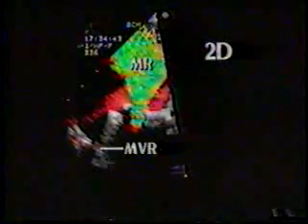In conclusion, accurate diagnosis of prosthetic heart valve dysfunction has traditionally been an exceptionally difficult clinical task. However, echocardiography has developed to the point where it can delineate most problems related to valvular prostheses. By using a systematic approach that integrates information from the 2D exam, spectral Doppler, and color flow imaging, the echocardiographer can non-invasively diagnose the majority of patients with prosthetic valve dysfunction.